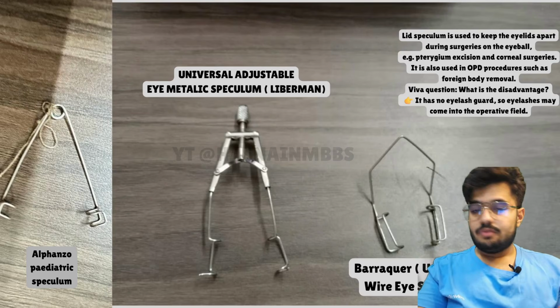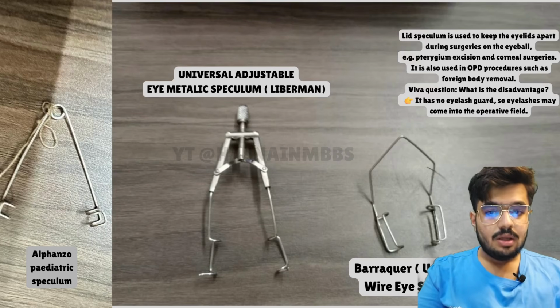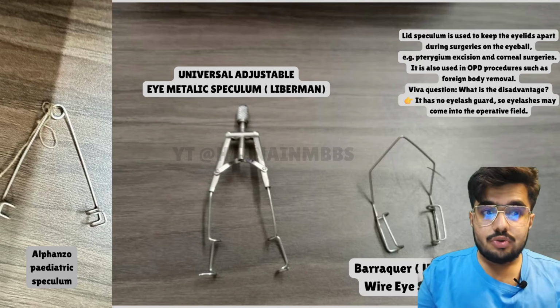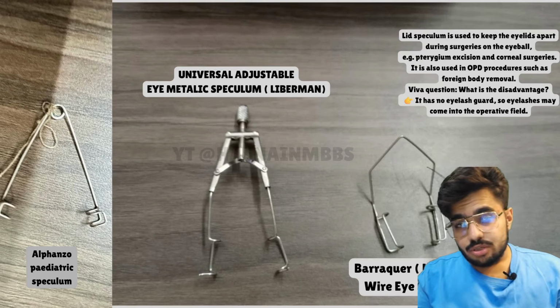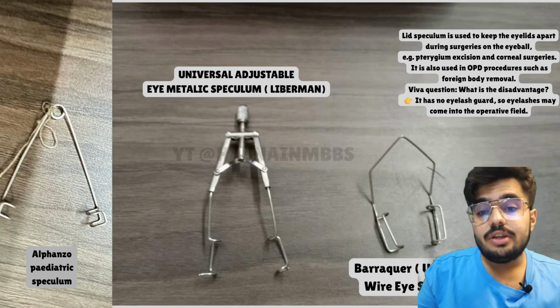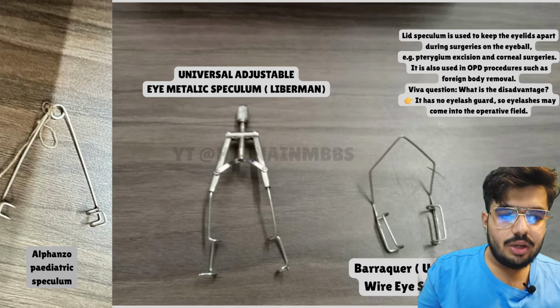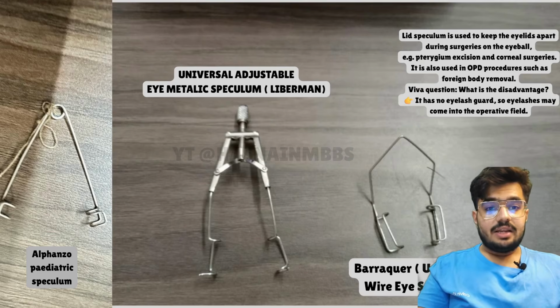So what are the uses? Once you have identified that these are eye speculums, you have even named the eye speculum. So now the use of the eye speculum. Eye speculum is used to keep the eyelids apart during eyeball surgery. What question may be asked, which type of surgery? For example, pterygium excision or corneal surgery. We even use this instrument for OPD procedures such as foreign body removal. So this was about the eye speculum.